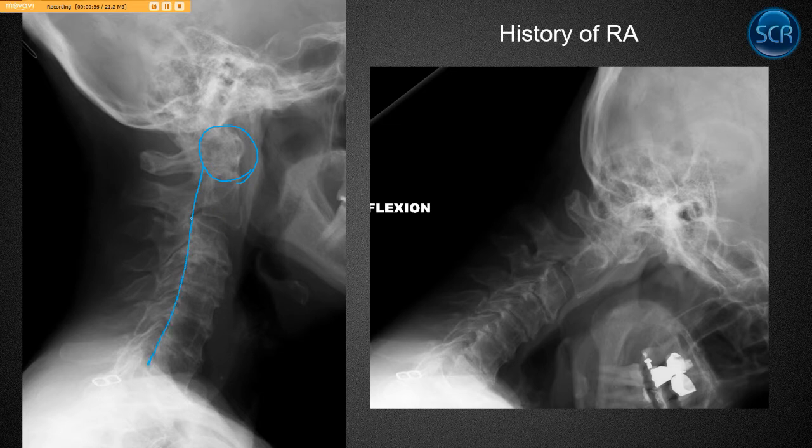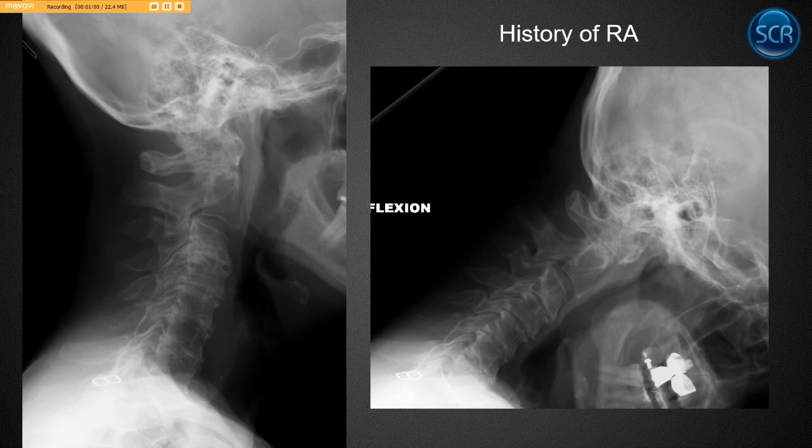So do George's line here. Of course, we see there's a spondylolisthesis. That's not what I meant to hit. And so going through and then going vertebral body, facets, posterior elements, and then skipping up to the skull, and we can look at our sella turcica there. That one looks normal, and then making sure we're checking our cervical soft tissue, see if there's anything back here like a nuchal bone, any mass lesions up here anteriorly. Look at our pharyngeal air shadow, which should be close up against.